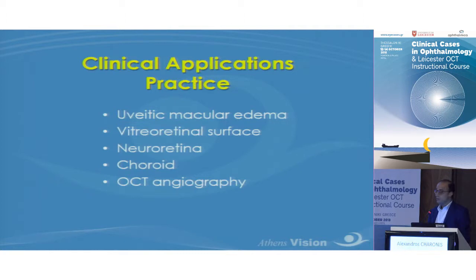Now, in the real world, in terms of clinical applications, that's what I'm going to try to emphasize over the next few minutes. We use structural OCT to study uveitic macular edema. Again, you heard by Dr. Talks, diabetic macular edema and macular edema from vein occlusions. Does that differ? Well, there are some differences in terms of clinical applications and management that I'll try to dissect. Vitreoretinal interface, of course, OCT is a great tool to monitor and study, and I'll come to some management decisions soon.